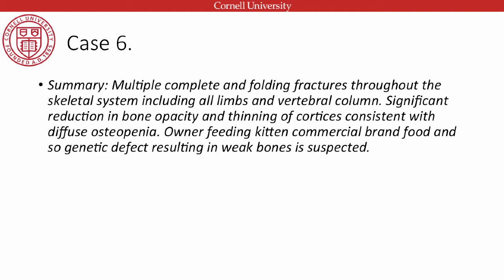There are too many fractures. It's like those little dragons, the bearded dragons that have that nutritional hyperparathyroidism. You get to the stage where you're not going to be able to recover them. And that's a really extremely severe form of metabolic bone disease that kitten had.